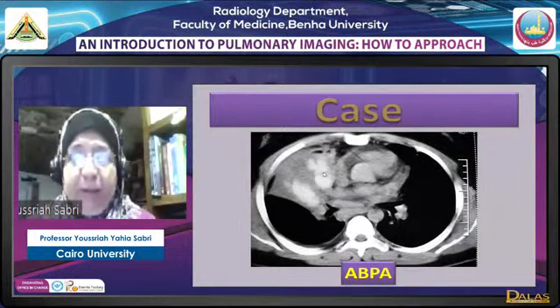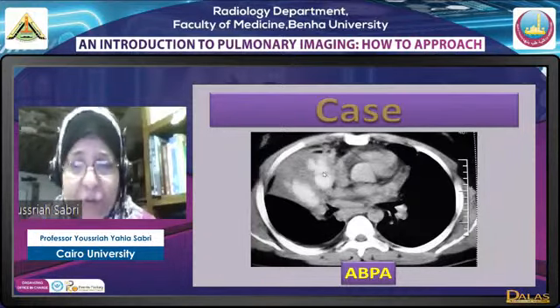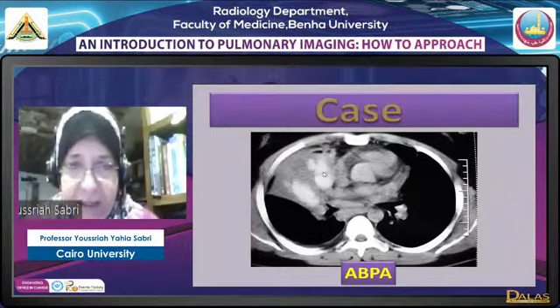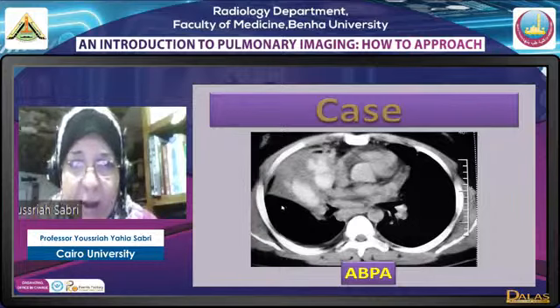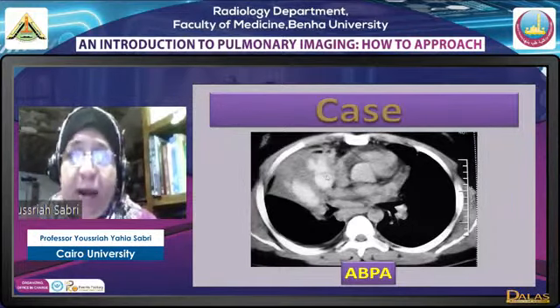It actually takes place when a patient has asthma or cystic fibrosis. This is how it presents, with fever and cough and so on. And this classic mucoid impaction that is white. Okay, why is it white?